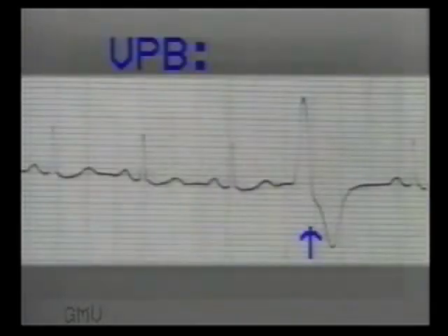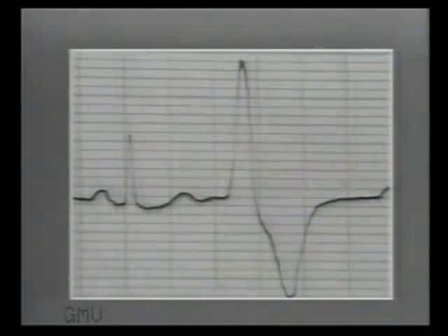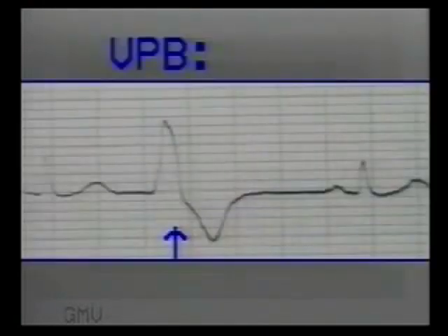But if the impulse arises below the division of the bundle of His, in one of the bundle branches or in the ventricles, then both ventricles will not be activated at the same time, resulting in a wide, slurred and bizarre QRS complex with T wave directed opposite to the main QRS complex. It is grossly different from the normal beats. This is a ventricular premature beat. Compare it with the normal beat and note the wide QRS with inverted T wave.